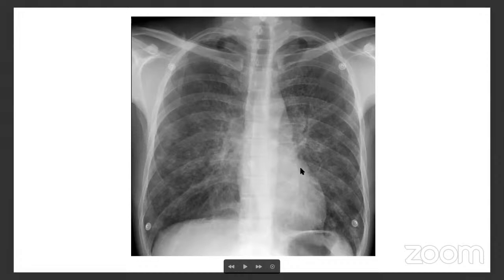To differentiate pulmonary edema, when you have so much change, you should see a bit more alveolar opacity, and there's no cardiomegaly and no redistribution of the vessels. Any infection, bronchopneumonia, you can still put as a differential. In this clinical setting, PCP will be the first thing we ask to test. If that's negative, then the patient might require further testing, even BAL, if not responding to treatment. So what happened to this case, Dr. Masood?